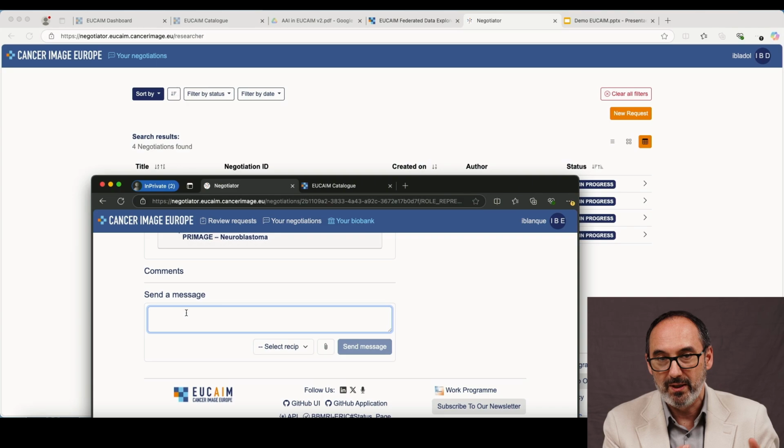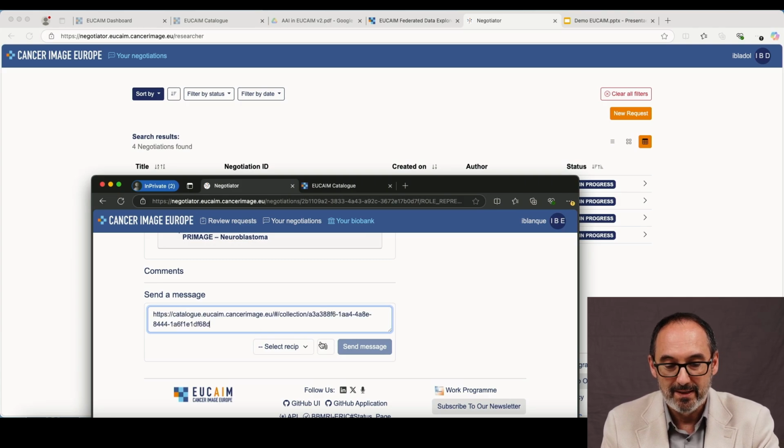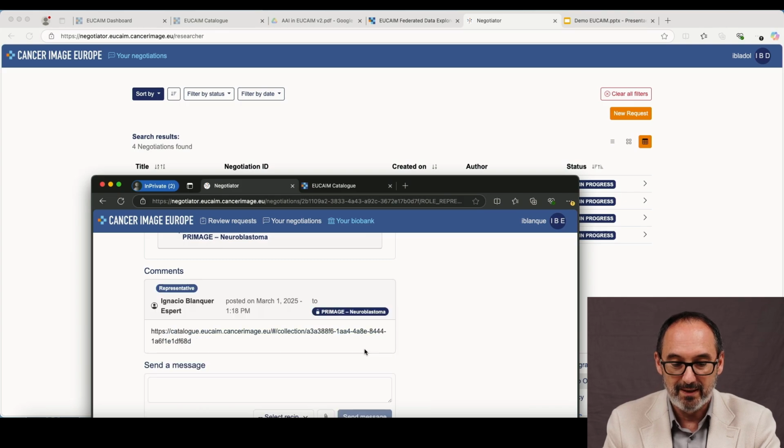We will have a user library in which the user can see the datasets as soon as they become available, right? So in this case, we have to manually let them know that this is the link for accessing the dataset. Okay, so we have completed all the process of providing the permit. At the same time, the data holder is updating the permits on the premises to ensure that this user will be able to access.